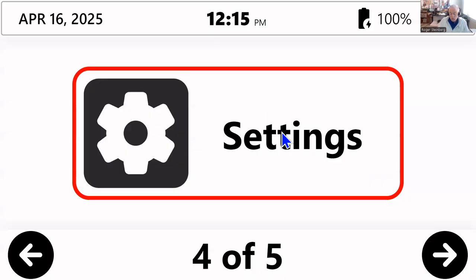So it can be navigable using those key shortcuts, really helpful also for those that might have physical disabilities to program alternative access devices. But that's why we have big, large icons on here. You'll notice that this carousel interface is also overtaking the entire desktop area.